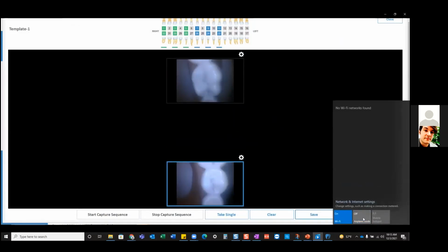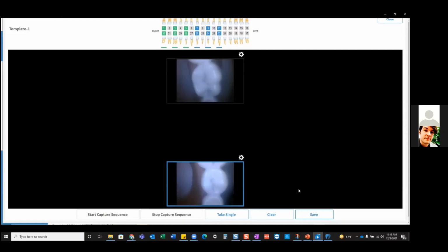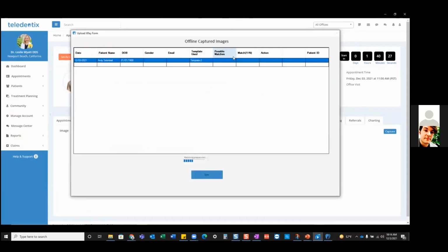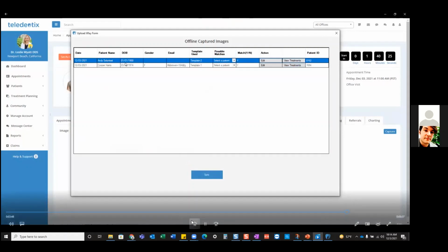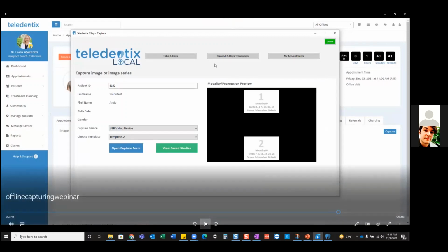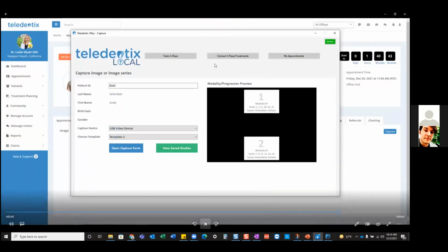Okay, awesome. All right. I'm going to turn my internet back on. So now I'm back. It's good. I'm happy. And I'm going to go ahead and get out of there. There we are. We're back into the capture here. I'm online. Great. Okay. Now, let me go back really quick because I want to highlight what I'm doing here. So once I'm back online, I can continue as if nothing ever happened.